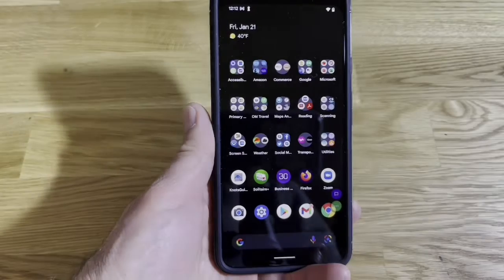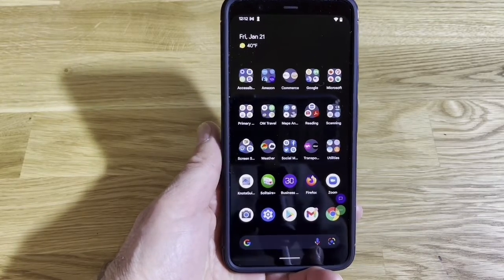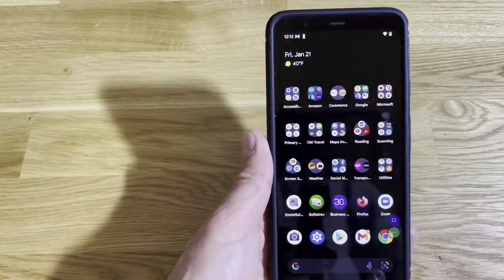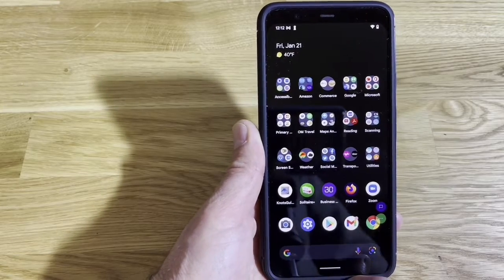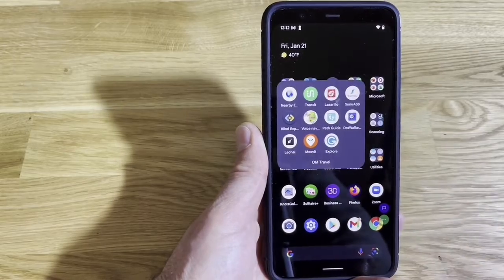Sunu app for Android. Okay, so we're going to spend a little bit of time talking about the Sunu app on both the Android and the iPhone. At the moment, we're working with the Android device, and they're very similar, but sometimes one gets updated before the other. Eventually, all the features keep up with one another on both phones. They catch up to each other.